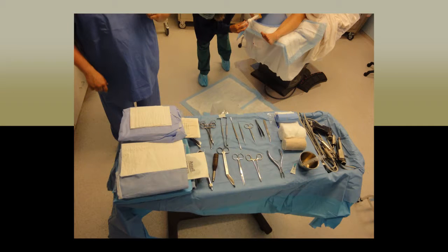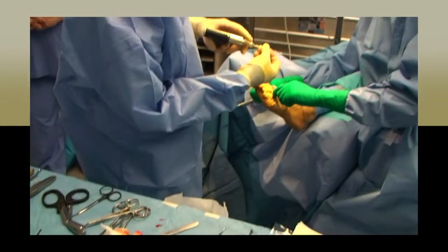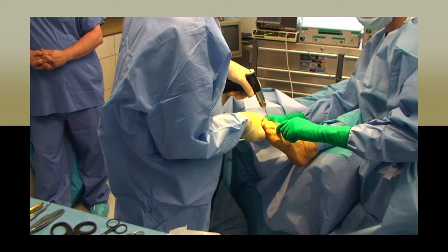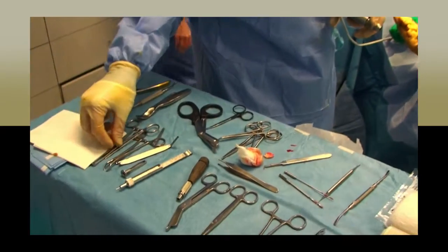The circulation assistant will need to set up each sterile field and instrument table. While the patient is in the preoperative room, you will be in charge of preparing the field. This, in essence, is the workstation of the surgical procedure. All instruments and supplies will be placed on this sterile field, and the surgeon and assistant scrub tech will be directly in charge of the maintenance of this field.